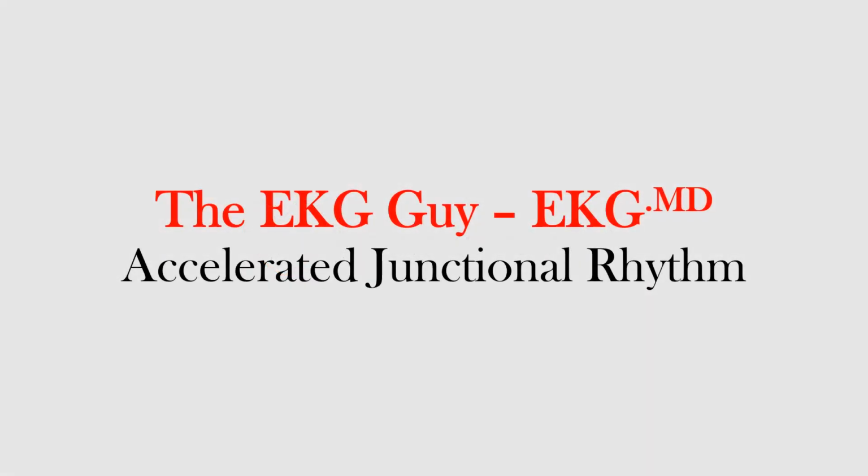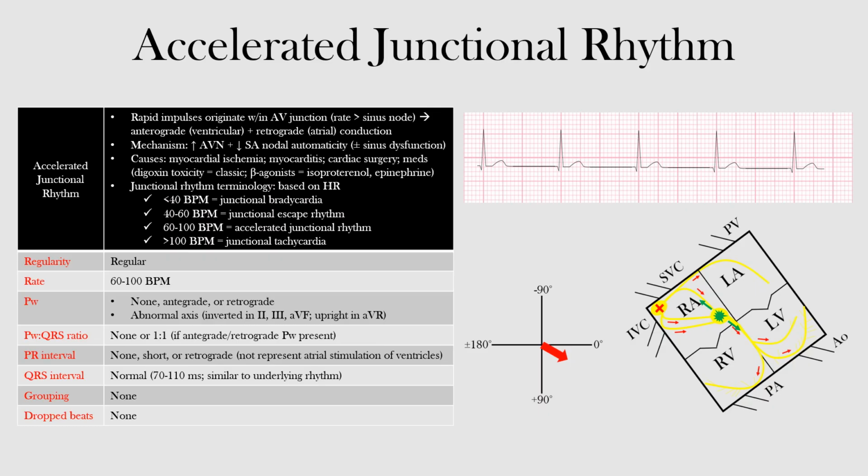In this lecture, we will discuss accelerated junctional rhythm, including its mechanism, potential causes, EKG features, and basic junctional rhythm terminology. Accelerated junctional rhythm originates in the AV junction, which typically includes the AV node and the bundle of His. It occurs when the rate of the AV junctional pacemaker exceeds that of the sinus node, yet still remains within the normal limits of the sinus impulse.